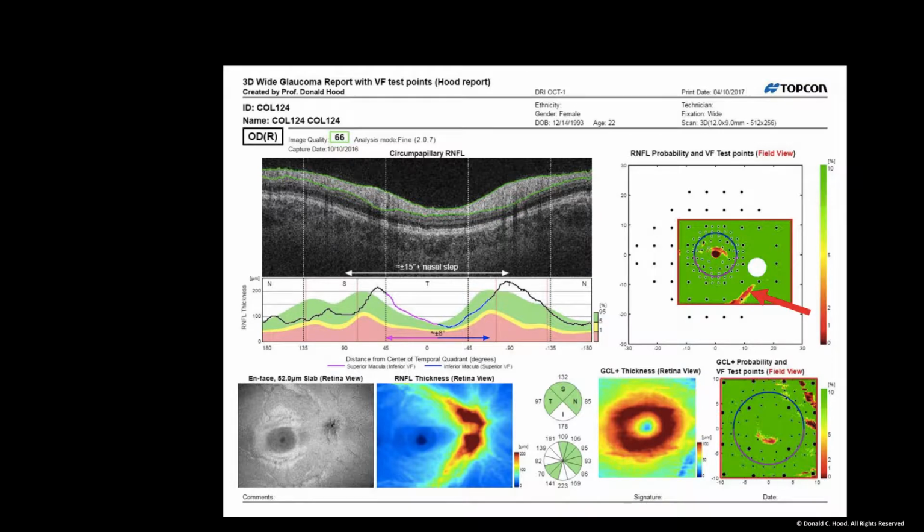What is it due to? Already gave you the answer. Is it real? This was a healthy eye, right? Well, if you look here, that's where the vessels usually are. In this particular patient, the vessels are here, creating this apparent artifact because of thinning right here. Technically right there.